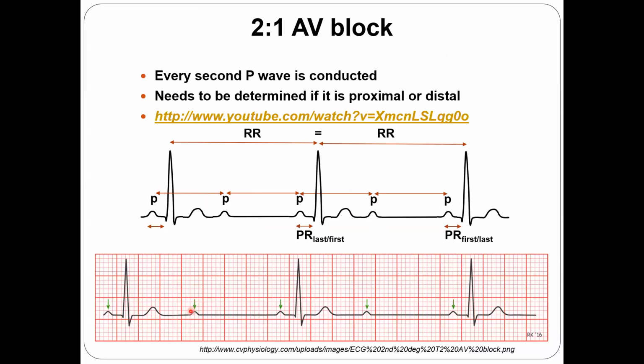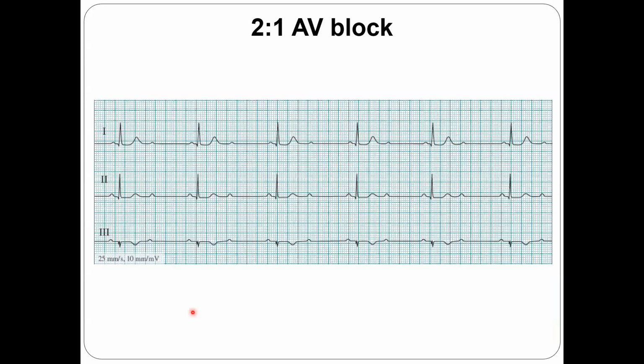I should mention that the T wave is bigger than a P wave. And if you have a QRS, you have to have a T wave. Don't forget it, because sometimes, when we were talking about impulse formation abnormalities, you might assume that the T wave should be the P wave. No, the T has to be there if you have QRS, and an additional wave should be the P wave, which is smaller and distinct from the T wave. That's bradycardic, as you see, and you always have a P wave with the same shape.